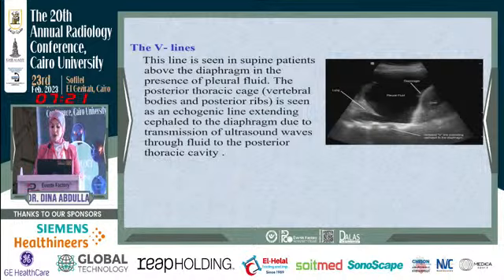Also, examination of pneumothorax in M mode. At the left side, we can see the normal seashore sign in M mode, as we described: the static layers of the chest wall and underlying granular, sand-like pattern of the lung parenchyma. However, the presence of air in the pneumothorax within the pleural space will obscure the evaluation of the deeper lung structure. So we will see multiple parallel lines, the barcode sign or stratosphere sign, as in the right image.